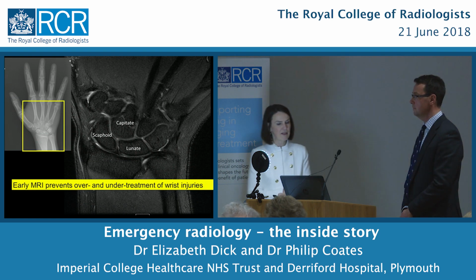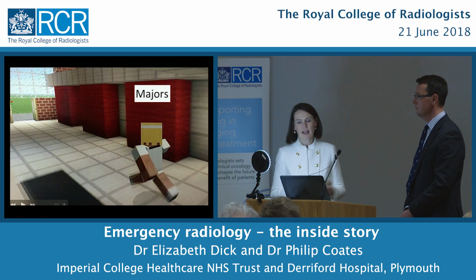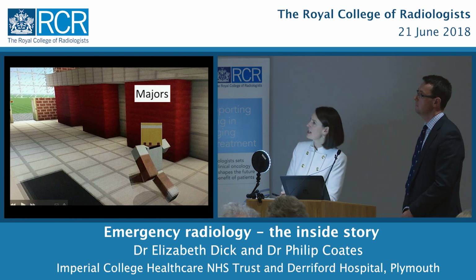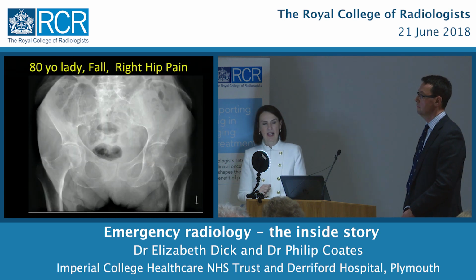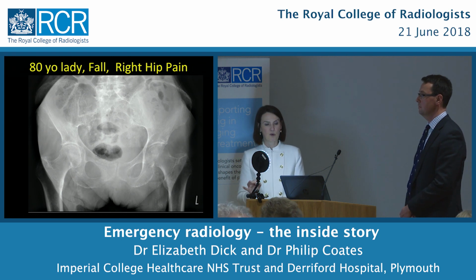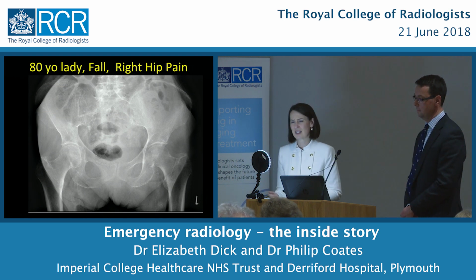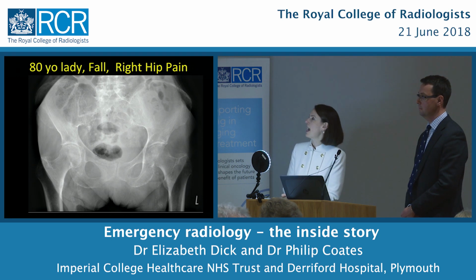Okay, now my final patient is back in Majors. It's almost morning time, it's 6 o'clock, but I have to see one more patient. And this lady is 80, and a couple of days ago she fell over and she's got hip pain. Now, I've looked and looked and looked at this x-ray, it looks normal, and the person who saw her at the time thought it was normal too, so they sent her home. But she still had pain, and she was desperate, she was trying to get around, but she couldn't. So she came back in, and at that point we decided to do a CT.